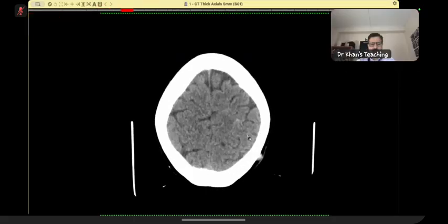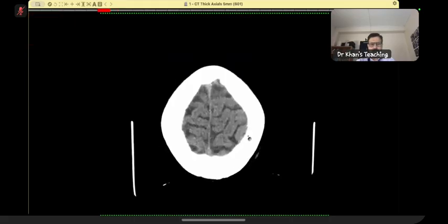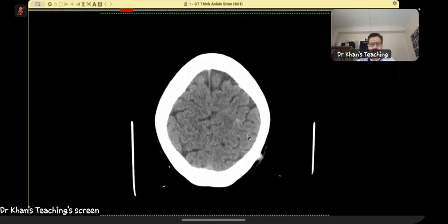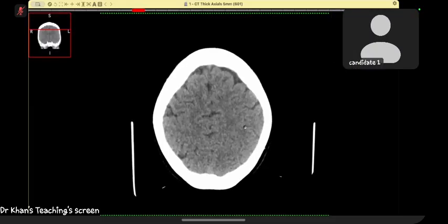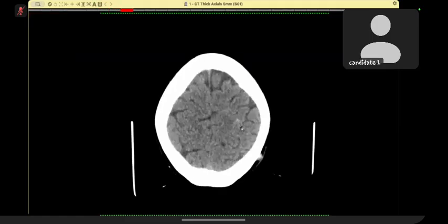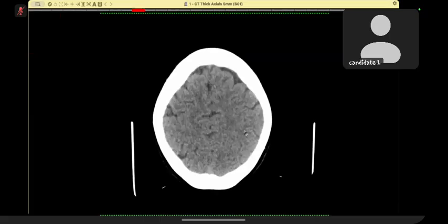So what else can it be? I can appreciate that the density is also there in a few lower cuts, and it is still in the cortical region in the gray matter itself.